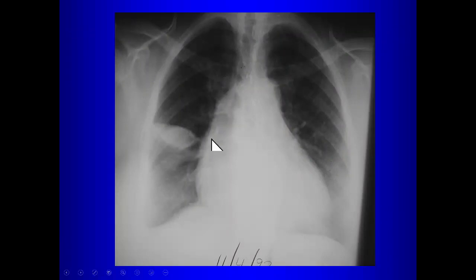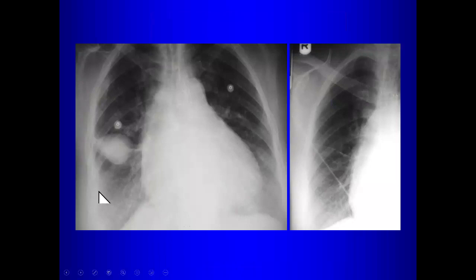And then sometimes pleural fluid can be loculated within the minor fissure, and that's called a pseudotumor. So if fluid is loculated in the fissure, it might look like a tumor. It's not a real tumor. This is a pseudotumor. And it can have this typical appearance, this biconvex shape. And another clue is that it changes shape on the frontal and lateral views. So tumors tend to be round on both views, but if we have fluid in the fissure, it conforms to the anatomy of the fissure, so it changes in shape between the frontal and the lateral view.